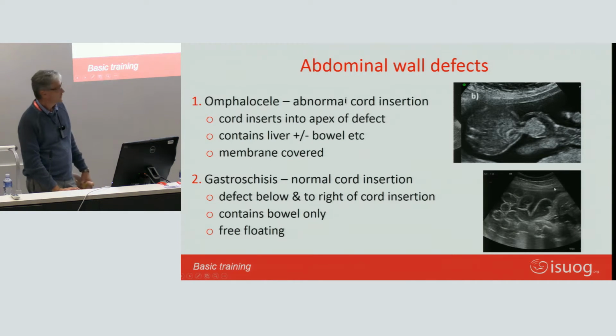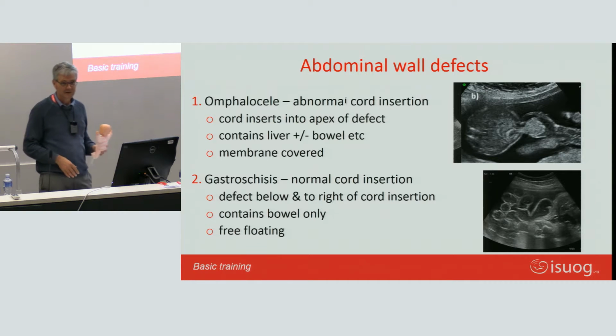And again, what we saw in the first trimester views, a little bit of hyperechogenic material into the umbilical cord. Is that a cord hematoma, or what is that? Well, it is there, right? It stands there, omphalocele.